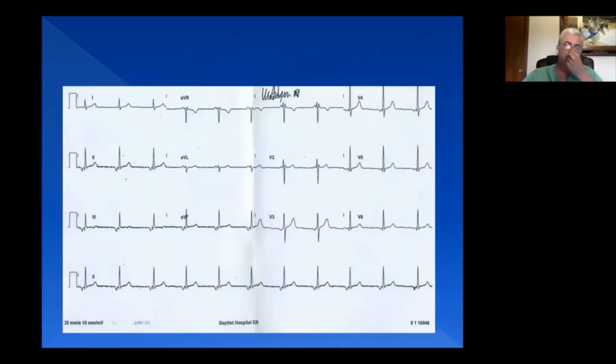This is another practice ECG. I usually have you guys do it, but I'm going to enjoy doing it myself. So here, this is the best place to be for a 12-lead ECG. And you can see the speed and the gain in one corner. You can see the test, 1 millivolt. QRS, look at it, narrow. And this is to highlight another thing. RSR prime, or rabbit ears, we always look at them and say there may be a right bundle branch block. The point I want to emphasize is that it doesn't matter if this patient has RSR prime. If the QRS is narrow, 100 milliseconds or less, it is not bundle branch block, regardless of what the shape of that QRS is. Narrow QRS excludes bundle branch block and tells us it's a supraventricular rhythm.